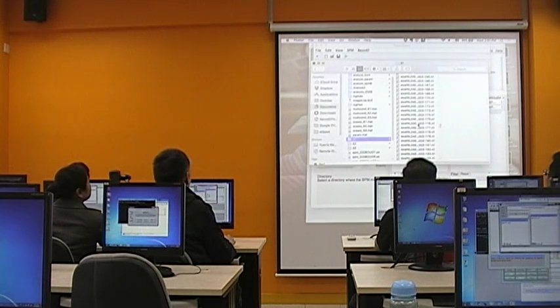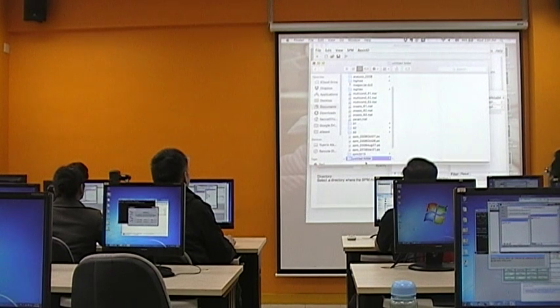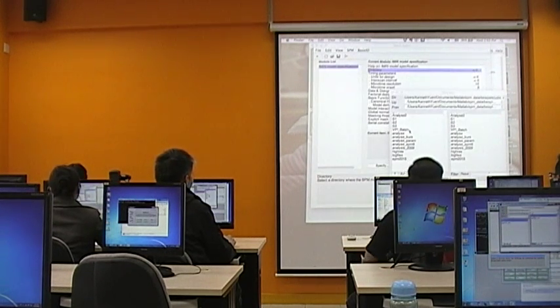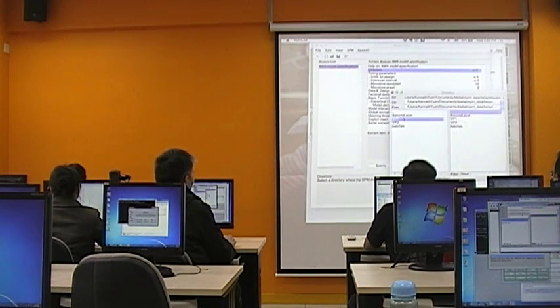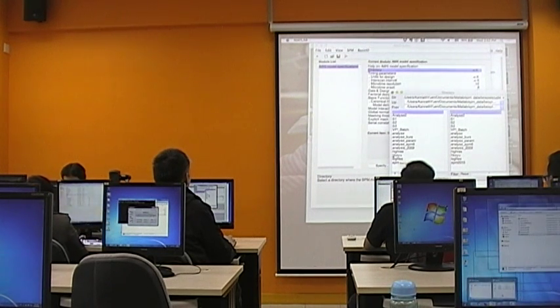Now this time I try to create a new folder called, let's say, HKSYU. This is the sample example model for the workshop here. Let me see if I already get it. No, not yet. So I just refresh it, go back, and then I see this HKSYU.